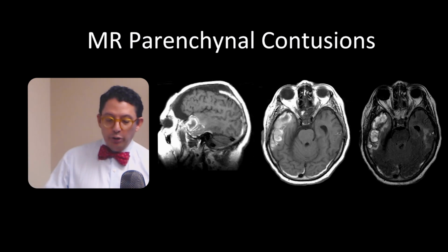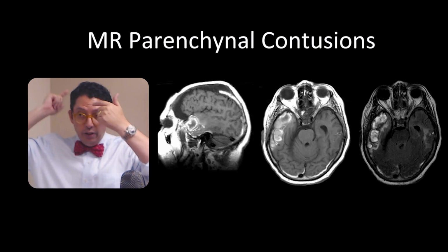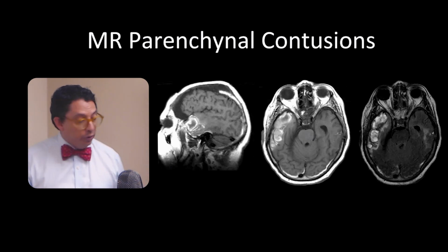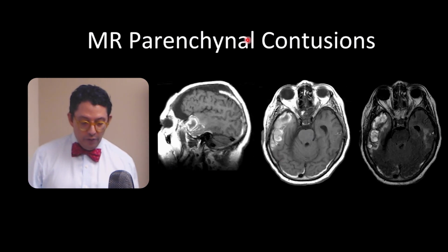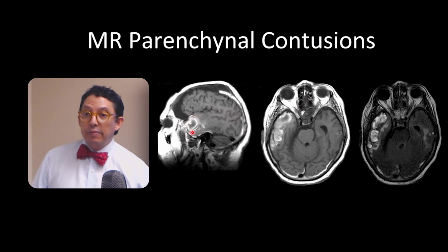And it can happen in multiple directions. It can happen from left to right, from posterior to anterior, and in any direction. It can be oblique. So this is a case that we have here where you have a temporal lobe lesion on the right side. This is a T1 MRI, and the hemorrhage is white, so it has to be in the first month of the hemorrhage.